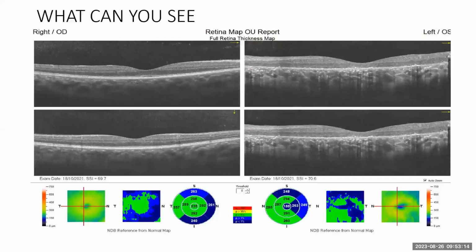All right then. So I'll leave this and ask someone to just tell us what you can see. And I'll tell you where to focus on. Focus on the outer retina, RPE segment of the outer retina, and compare the left to the right and tell me what you can see really. Any volunteer? I'm putting my arrow on where you should check. Here, all the way to this side, and compare it to here, all the way to this side.